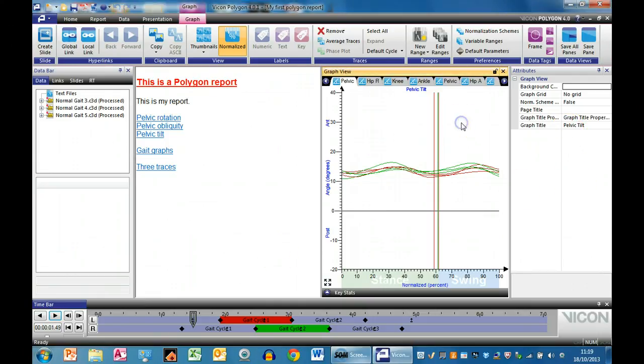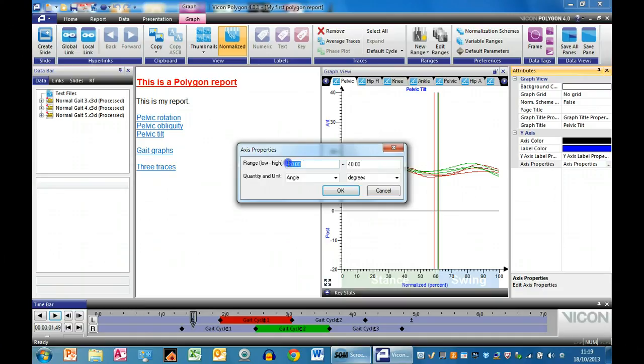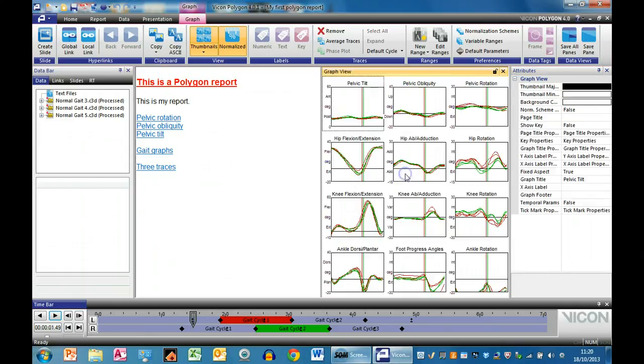So to do this, I go and click on the graph, but then I click on the labels on the axis, and you can see that this gives me details of what's happening on the y-axis, and I can change the axis properties. So I can click here and then click on the 3 little dots, and you can see that it allows me to change the range, I set it to 0 to +60. Okay. Then I can come down here.